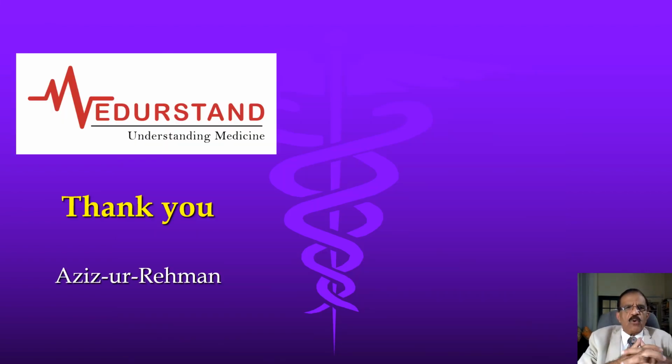So this was about ECG localization of myocardial infarction. I think we have learned that in NSTEMI there would be persistent T wave inversion, no ST segment elevation, and changes will be seen in multiple leads, and it will be difficult to exactly localize the infarcted part.